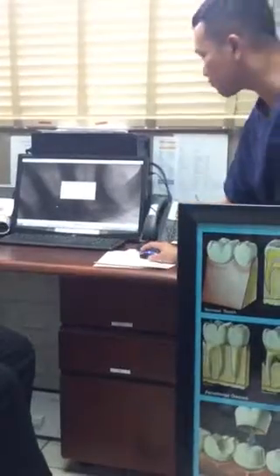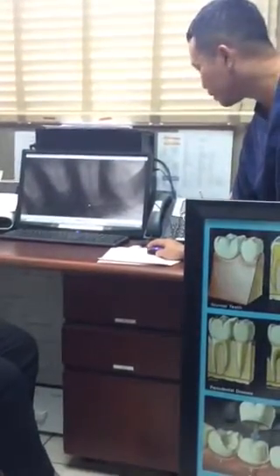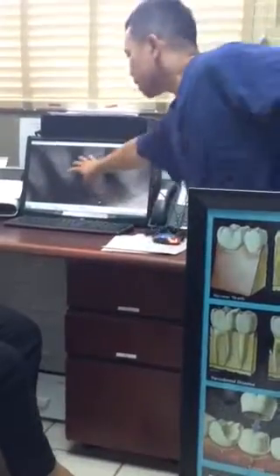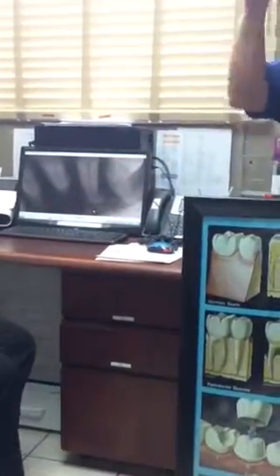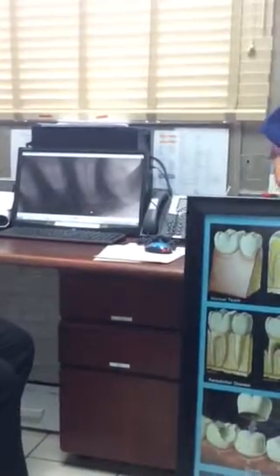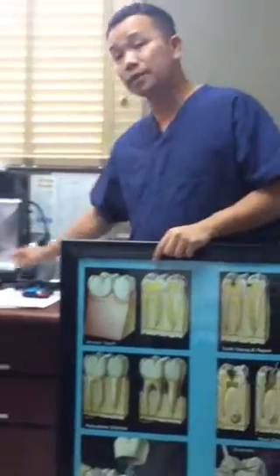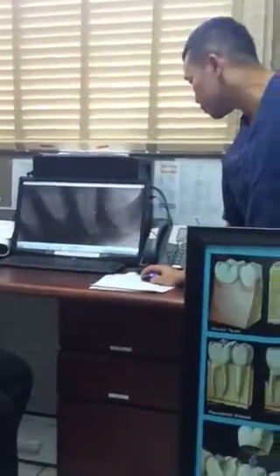Now when you see, well, what's the difference between this here and this right here? Well, this has had a lot of trauma to it, a lot of pressure to it. That's why it's opened up a little bit. It's kind of like if you put a post into the ground and you just stomp on it a little bit, that hole's going to get bigger and bigger. Same thing here, but that is not an abscess, right?